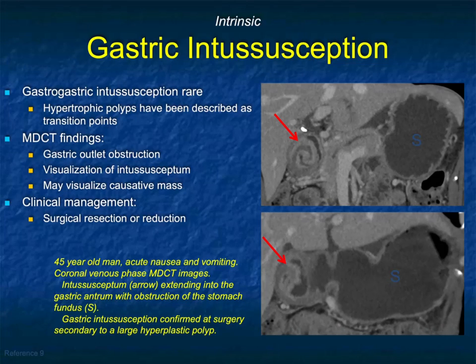We think about small bowel intussusceptions, anywhere ranging from the intermittent incidental jejunal intussusception to metastasis to tumors in the small bowel. We talk about tumors in the large bowel like cecal tumors intussuscepting or intussusception at the ileocecal valve.